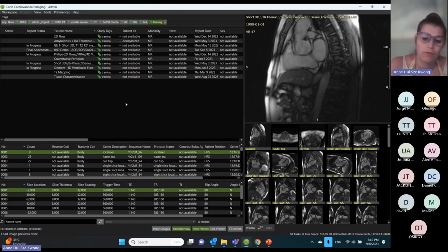Just to let you know, you will have the general version on your own computer, but inside the hospital, the software can always be connected to the MRI, to the PACS, to the RIS system, to the printer, whatever. Everything linked to the DICOM connection can be connected to Circle without any problem. This is how people in the clinical setting are working in the hospital.